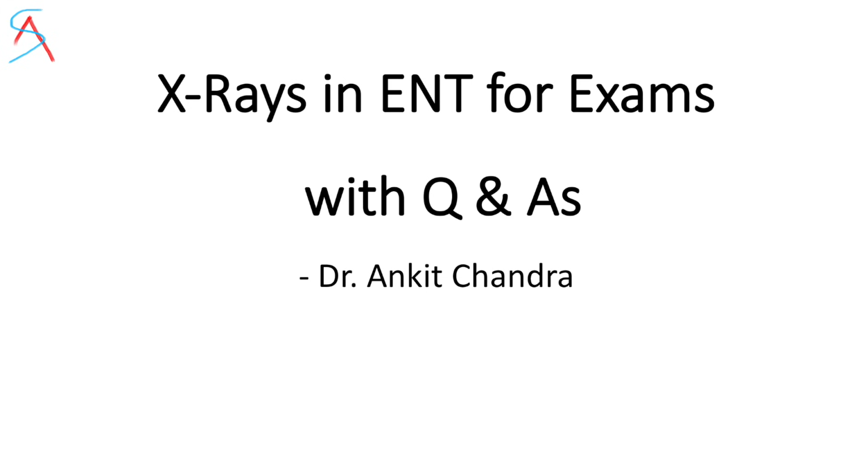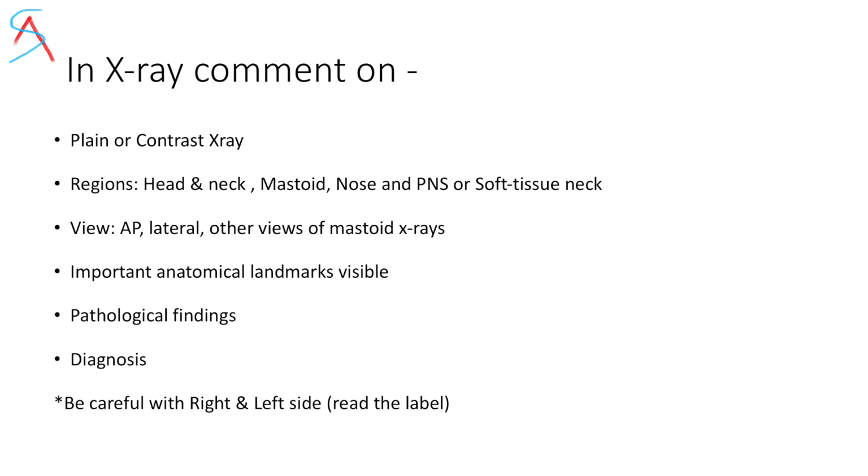Today I'll tell you how to read X-rays in ENT and how to prepare for your ENT exams. So first, you should know how to comment on an X-ray. First, you have to tell whether it is a plain or contrast X-ray. You have to tell which region is visible, like whether it is head or neck, or is it nose with paranasal sinuses. You have to tell what view it is.